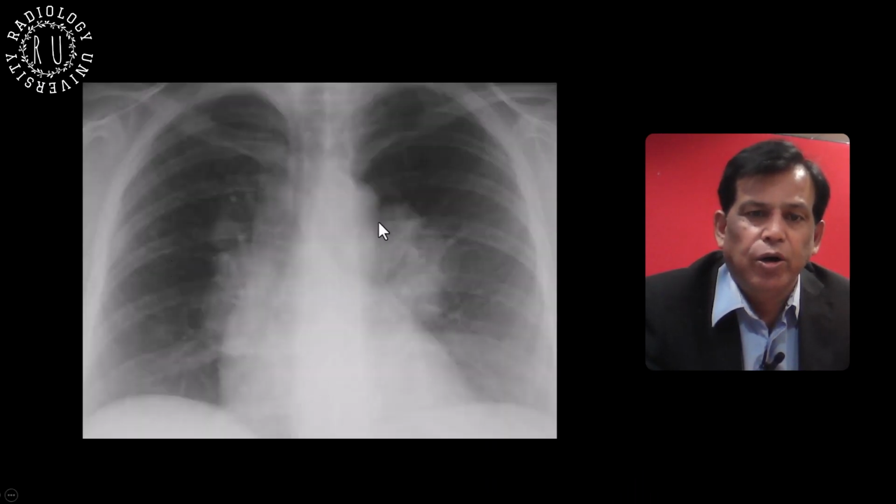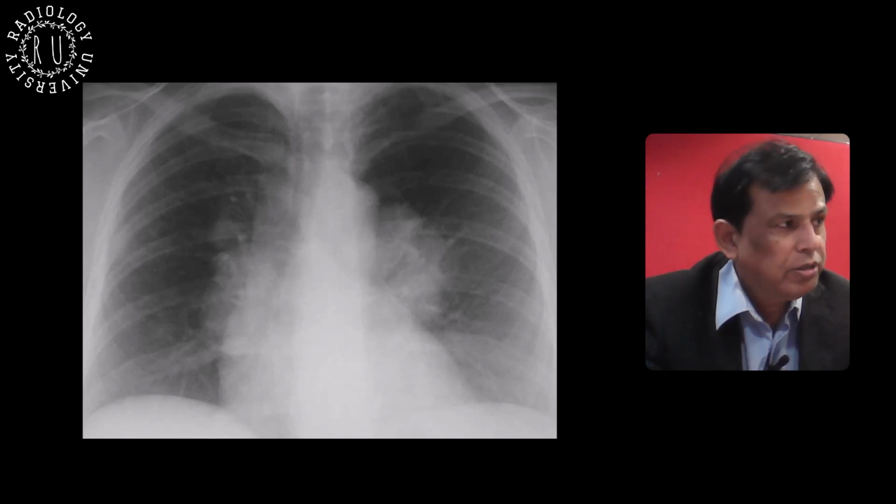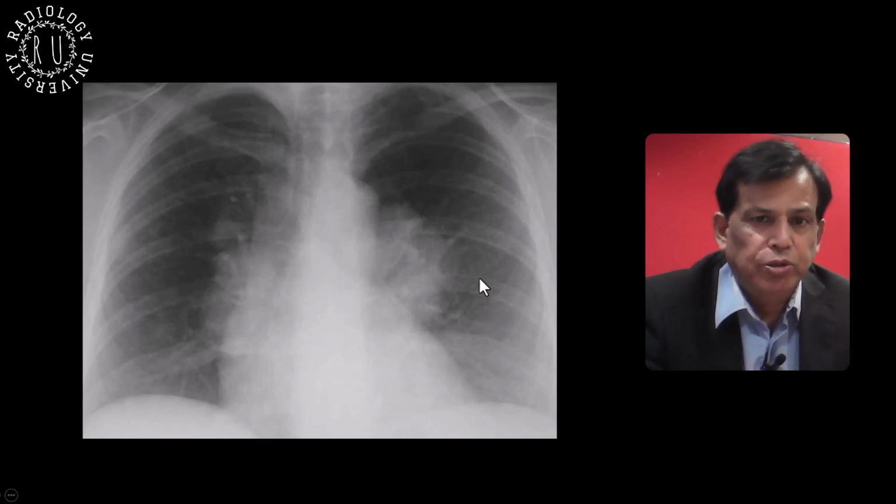This case is an Aunt Minnie, a spotter. You will get this in the exam. If you get this, it should come out within 1 or 2 minutes because you just clearly define the appearance. Say it is lymphoma or sarcoid. Ask for any skin lesion, anything, just to get an idea. If you say sarcoid and lymphoma, then you can ask about management. You can ask to do a CT scan and staging CT, and the management part of it later on, depending on what it is, because both are relatively treatable conditions. The reason I'm showing you this is that the film will come and you will definitely see it.